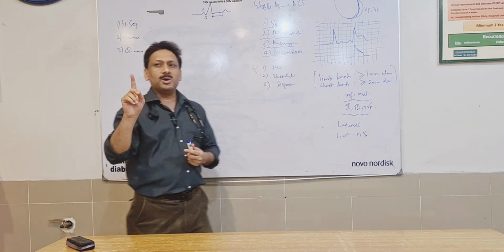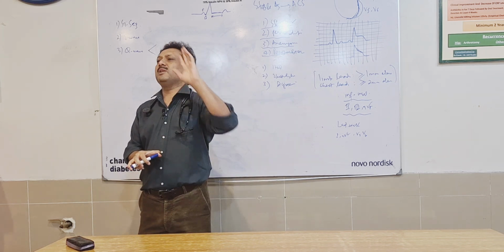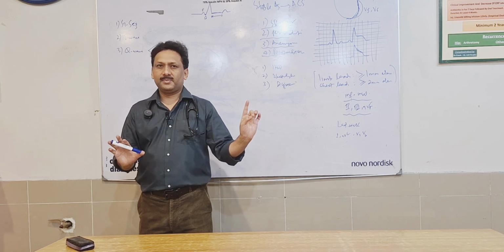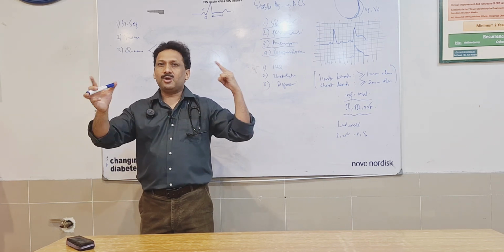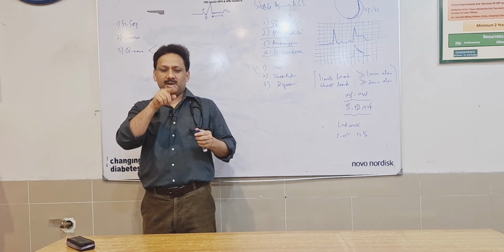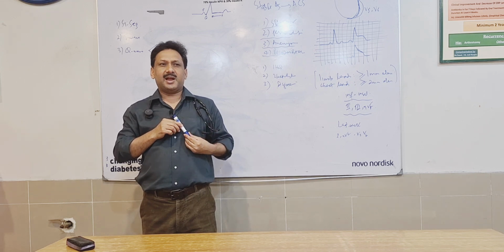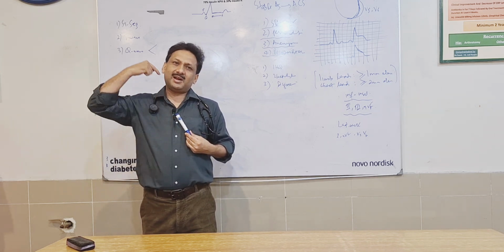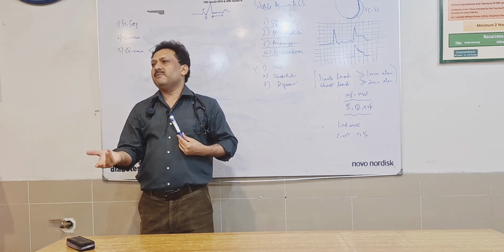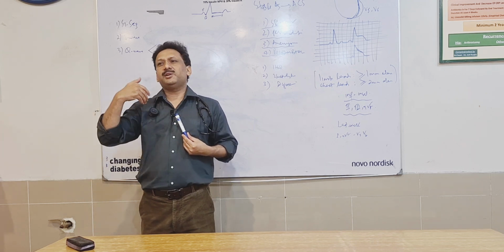And before jumping on to the next thing, a very important point related to the normal T wave, inverted T wave. So a T wave can be normally inverted as well. Recall that I told you that if the direction of flow of current is towards the cardiac axis, say in a person the axis is directed like that, so the lead which is exactly opposite, which is AVR, is normally showing T wave inversion. So that's normal T wave because it is exactly opposite to the cardiac axis.